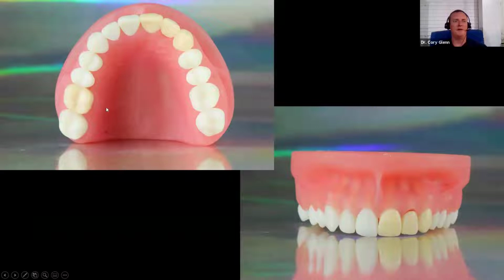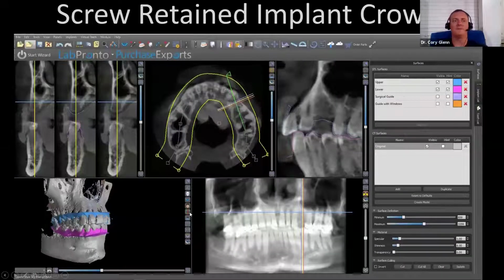I went ahead and printed the bridge and the single crown, and you can see the fit of those. I wasn't holding it down with my finger here, so it's unseating on the margins just a little bit right there. But the fit on these is excellent. It really is comparable with most of your ceramic crowns. So, just a couple clinical cases.